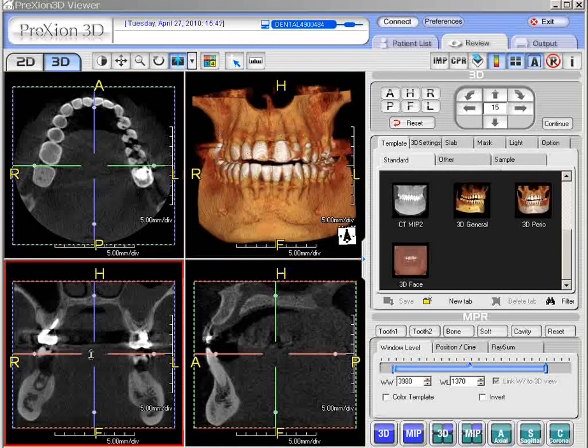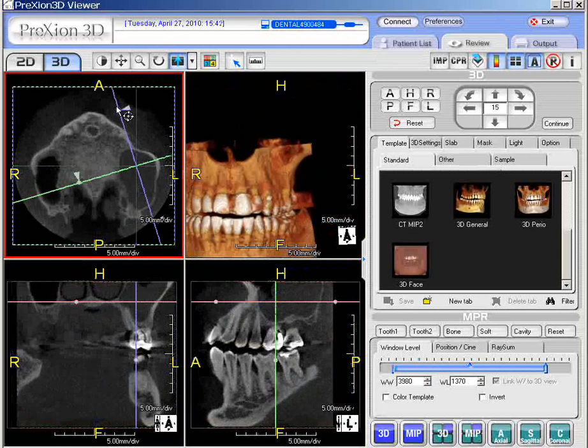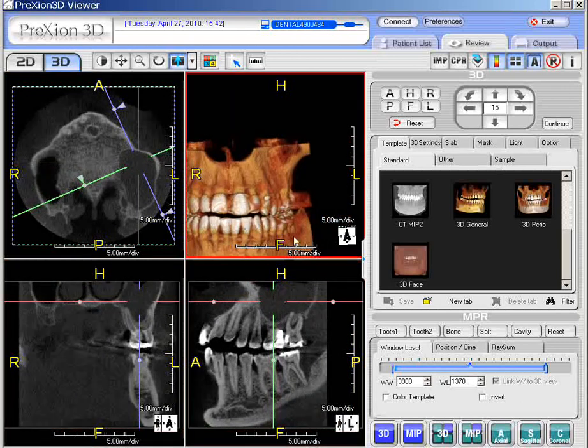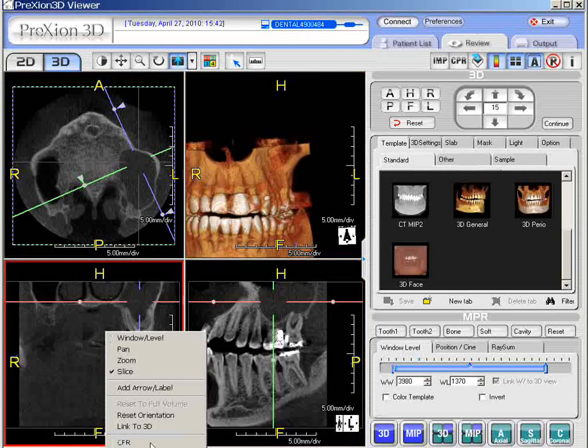if you want to save a particular feature that you want to do, let's just go to, let's say, this screen here. Let's say you want to save this and save it to the output panel. So a number of ways of doing that. Wherever you're pointing your arrow, you see the red frame around the outer periphery, that is the active box. So you just press the C on the keyboard with the highlighted red box around the frame, whatever frame you wish, or you can right click, you can capture whatever the red frame is as a single capture. If you want to capture all views, press capture all views. It captures everything on the screen. So that is how you can capture images.